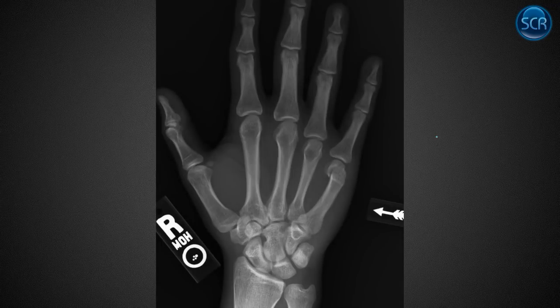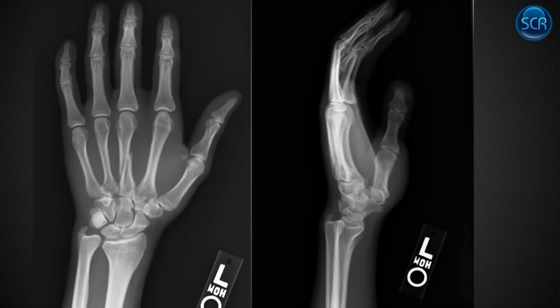All right, so this is a hand X-ray. I've zoomed in a little bit here on the finding. This is a typical fifth metacarpal fracture. They hit a wall with the side of their hand, or they punch someone poorly. Some people call this a barroom fracture. Other people call it a boxer's fracture, a bad boxer, I guess. But this is a typical metacarpal fracture at the fifth.